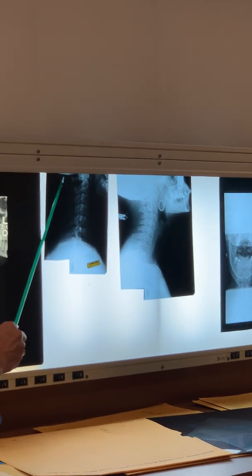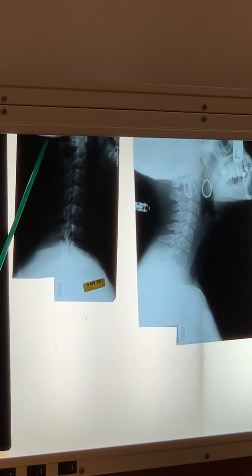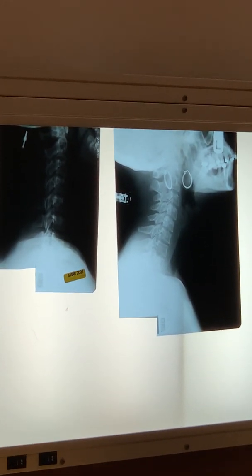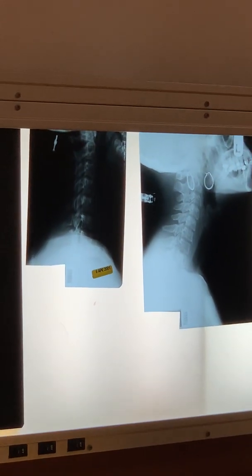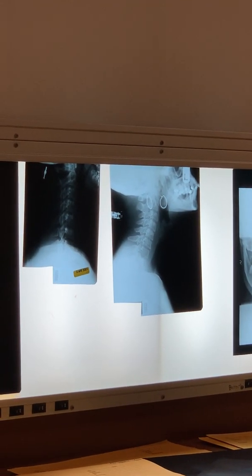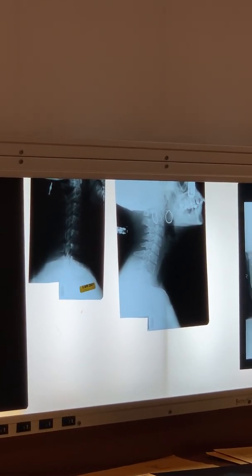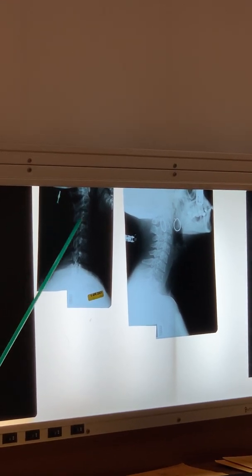What is that? Not overexposed, because that looks whiter. I don't know what that is. It could be one of those plugs or whatever you call them. A hearing aid? No, that would be too low, but it looks like a little bit too oblique, so that might be some kind of earring.